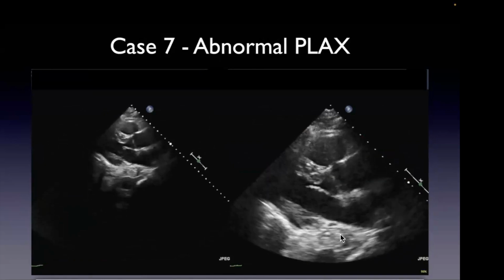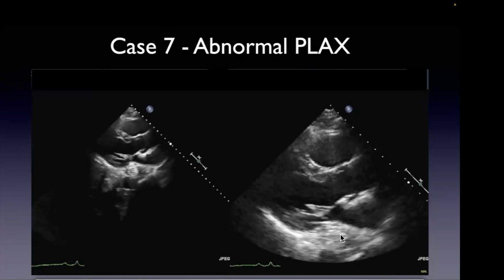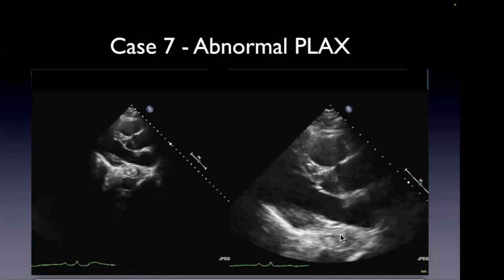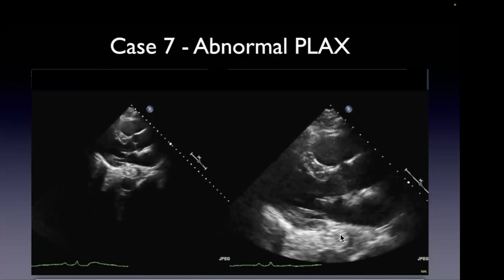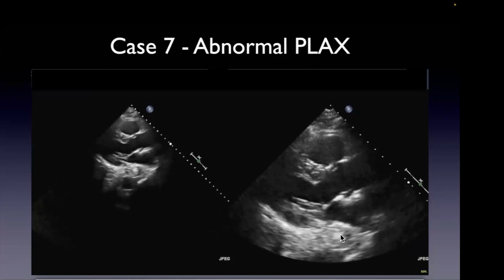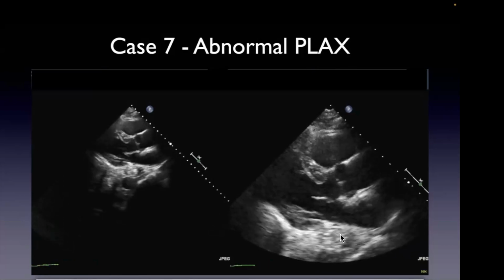What kind of stent is it? It could be a TEVAR. Well, EVAR is usually in the abdomen. This is up in the thoracic cavity, right? So that's why the T in TEVAR is thoracic, thoracic endovascular aortic repair.